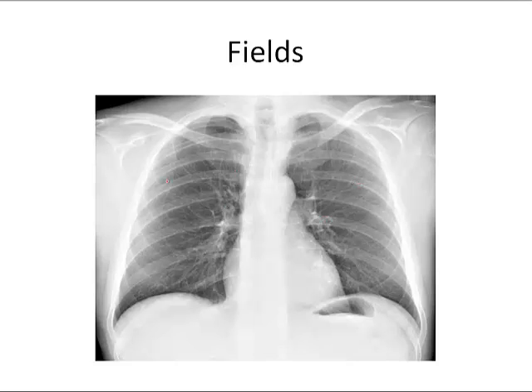Take a look at this vasculature that you can see. When you look right out in this area, you can see that the vasculature tends to taper out, and it's hard to see all the way out here. In general, it should be about 2/3 of the way out from the center out to the chest wall is normal. If it goes all the way out to the end, then that's suggestive of heart failure, pulmonary edema, increased pressure within the vasculature.